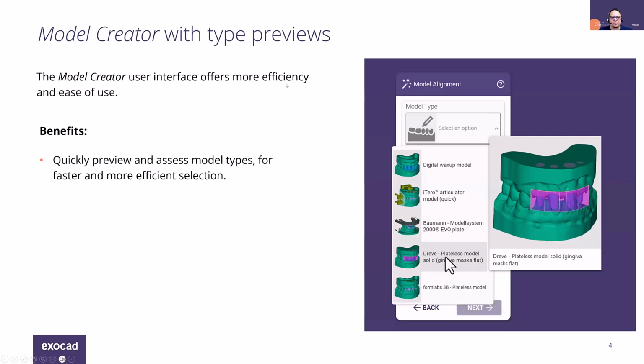Up next, we have a couple of features with ModelCreator. From the UI, we've added tooltips here that give a quick preview of the different types. This is especially useful for training and new users to understand what type of model they're going to be producing with our software.